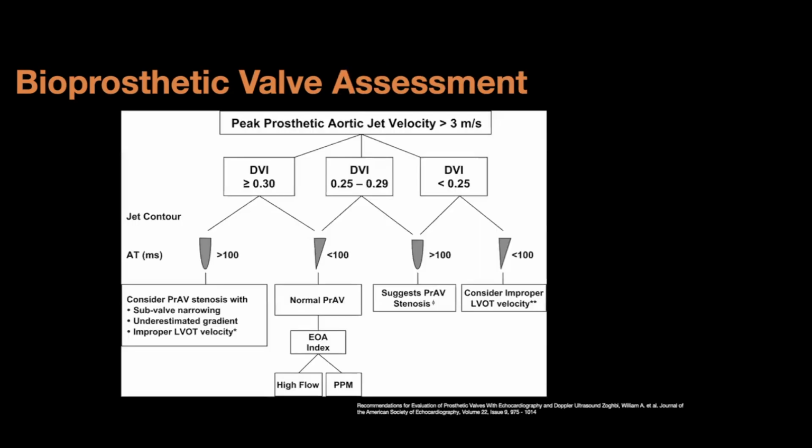This wasn't necessarily the case for this patient, but this is more related to what we usually see when looking at prosthetic valves, the flow across them and the gradients, mostly in TAVI patients in terms of severity, although in this case it's the opposite.